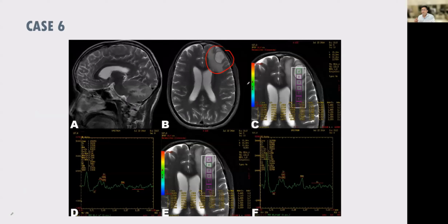Now comes the game of conventional imaging, where you need to be very strong in conventional imaging to diagnose this condition. So yeah, I've not given the contrast. So this is where we fall. Let us approach this lesion. The lesion is a cortical based lesion. I have not given the contrast. The age of the patient is old age, and the edema is slightly disproportionate. And if you carefully observe, there is another lesion here in the cerebellum.